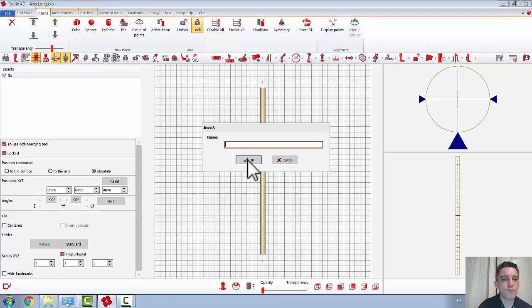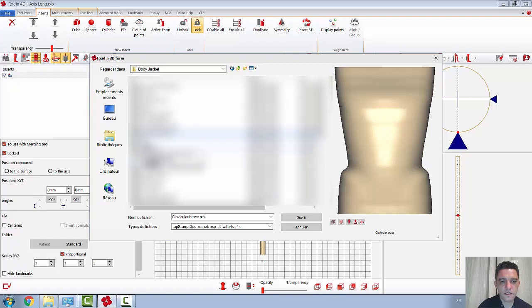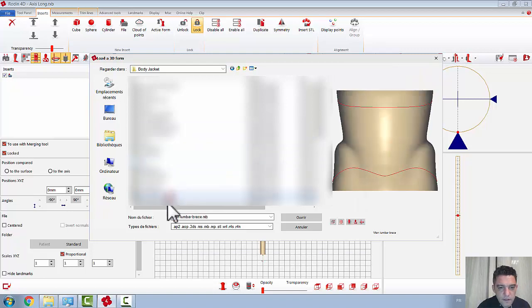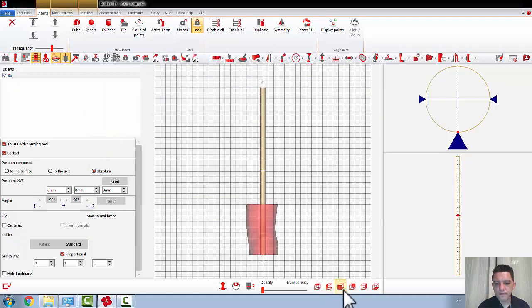I was thinking, for example, in my library in UK, you have a body jacket. This one, in these cases, I want to select a shape with a good waist. And the trochanter also is important because you need to think that the CAFO I want to merge has the upper part. So let me, for example, this one, I think this is big inclination here, so probably this one is much better. Okay, front view.